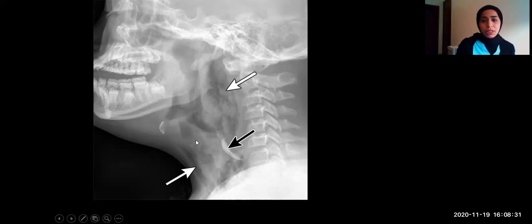Additionally, there is surgical emphysema and lucency all around the prevertebral soft tissue at the level of the trachea and in the anterior neck space. This is a typical ingestion of foreign body complicated by a perforation of either the trachea or esophagus. So subsequent imaging studies are needed to evaluate the area of perforation.